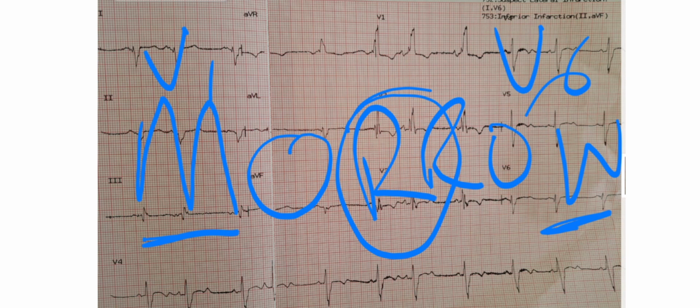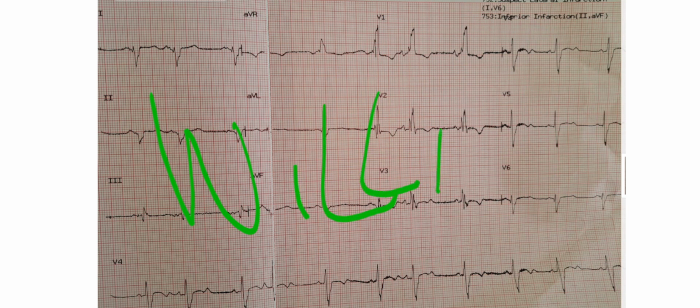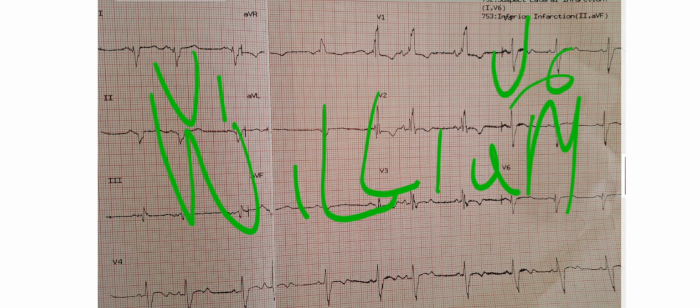If you have been watching, you'll know that if it was a left bundle branch block, we have William there. We have William, meaning V1 is W and in V6 the QRS is M-shaped. Then that would be a left bundle branch block.